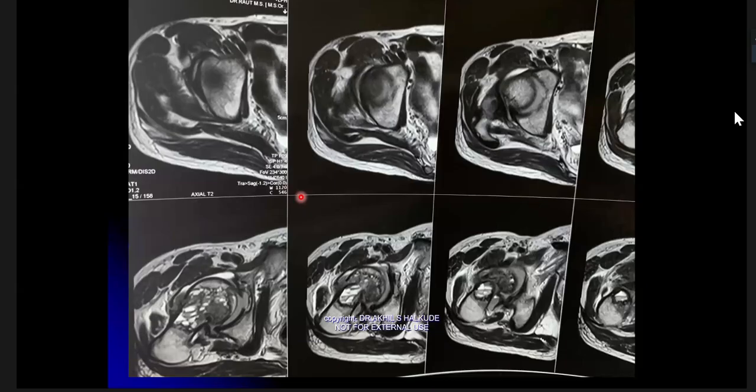Solid, and so ABC is cystic. Very good. So GCT is a solid tumor, that is, a giant cell tumor is a fibrous tissue. That's why it looks blackish or hypointense on these T2 weighted images. And after giving contrast, the soft tissue enhances, whereas ABC has cystic areas. So cystic lesions will enhance, showing peripheral enhancement, but there will be no definite soft tissue components.